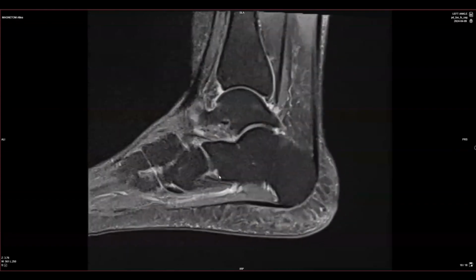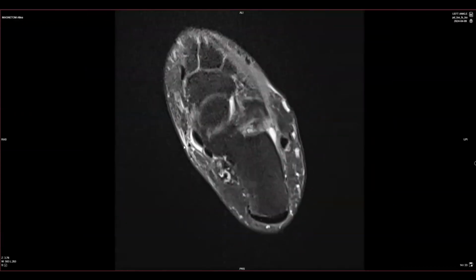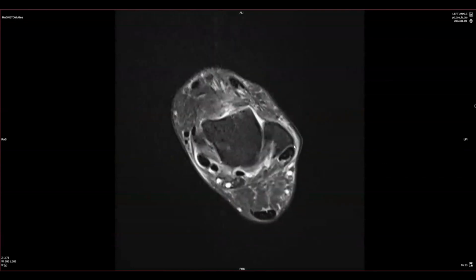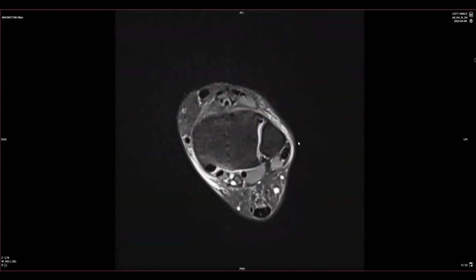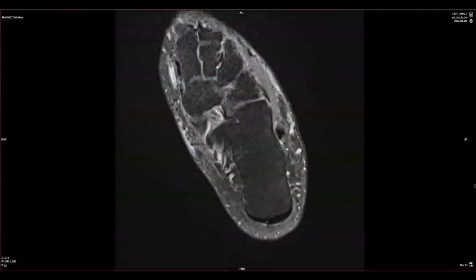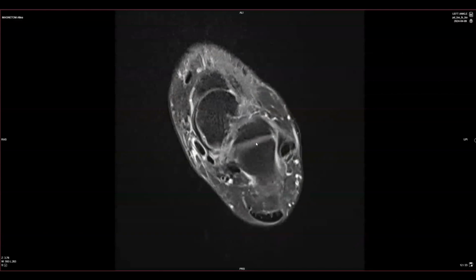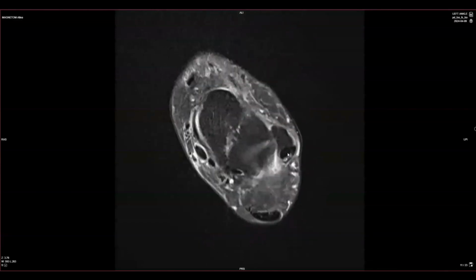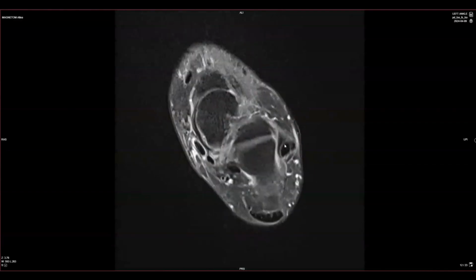And that's it. So in the impression altogether, what I have is hypertrophic PT tendinosis, medial flexor tenosynovitis, and stress-related edema medial malleolus. We have peroneus brevis split tear, superior peroneal retinacular tear, and lateral synovitis. This feature here is more closely linked to being in a pes cavus or a cavus varus situation. So those features that we saw in the x-ray may be mixed biomechanic in this person, but nonetheless they have these features of peroneal tendon tears. That this here is not an acute tear, this is a subacute on chronic type of injury.